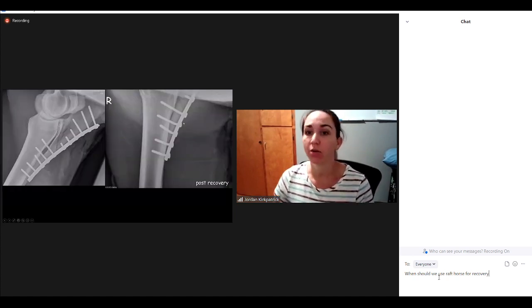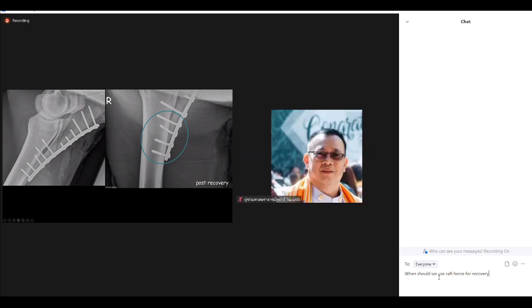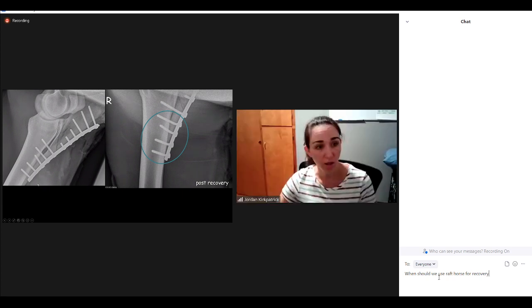This is that olecranon fracture from earlier. This was the repair in surgery, and then this is his repair after he stood up from recovery. The big thing to notice is right here, 4 of the 5 screws below the fracture line are bent. This one is bent right at the plate interface. This one's bent just a little, but they're all straight here, and now they're bent.